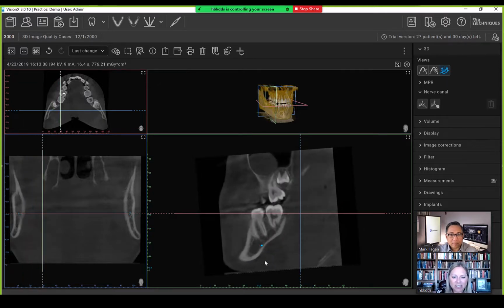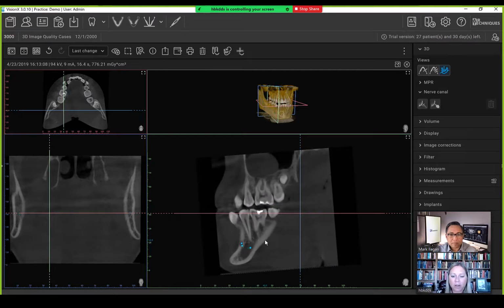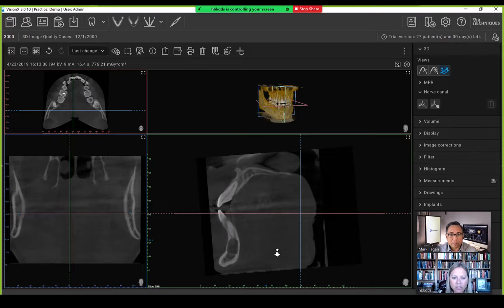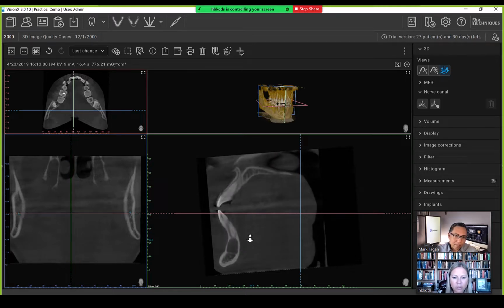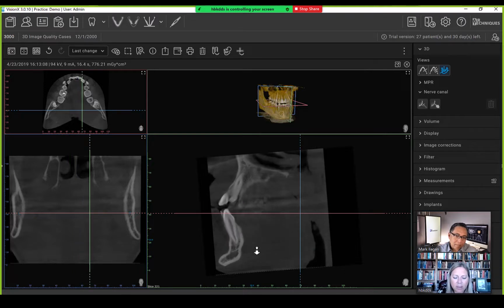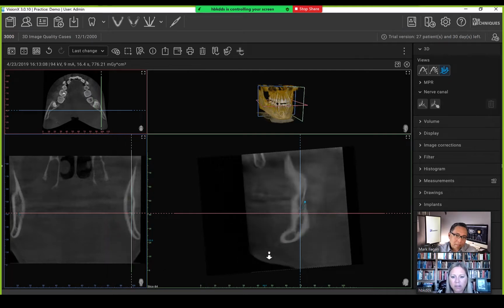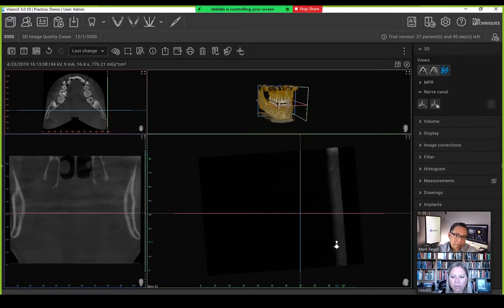All right. So let's come down through here, and I'm looking at my periodontal ligament spaces. This is great. The sagittal is great for looking at your periodontal ligament spaces. You see it really nicely and see what's going on with each of the teeth. Obviously, our issue here may be interesting. Yeah, you can see that root apex right there as well. So definitely wanting to see if we have any type of root resorption with that particular lesion. That's really nice. And all the way to the left-hand side. All right, perfect. You can barely catch those little condyles, just a little bit, but all right.